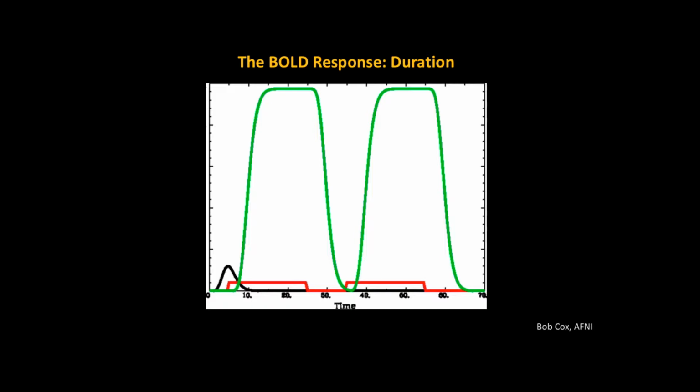So it looks like a pretty high amplitude, but still we're going to be in the modeling part. We're going to be modulating this to try to best fit the data. All I'm showing here is that the HRF tends to be extended even further in time depending on what the nature of the stimulus was. Presented for a long time, it gets extended in time. If it's very short, you tend to see more of the pattern of the HRF.